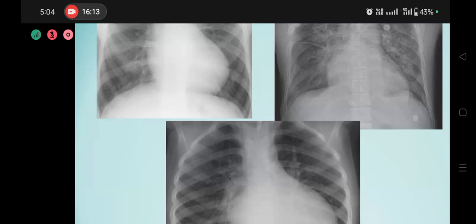On the other hand, in some hearts, we find that the heart is more horizontally displayed, and the apex is somewhat lifted up from the diaphragm. This apex is lifted up, this apex is dipping into the diaphragm. Now you see, because of the lifting of the apex, this angle is very acute, whereas this angle, because the apex is going down below, is an obtuse angle.